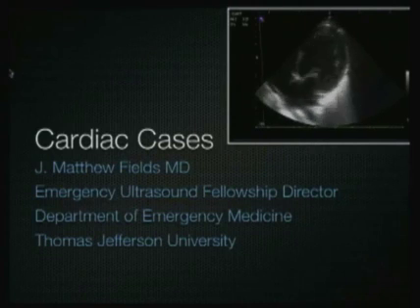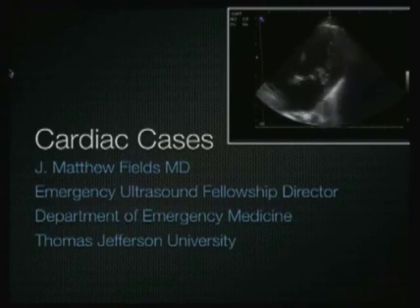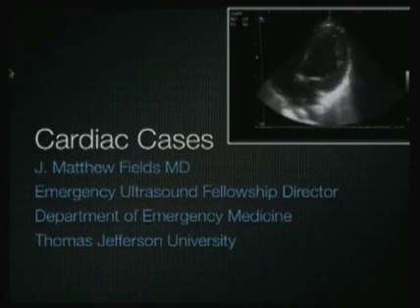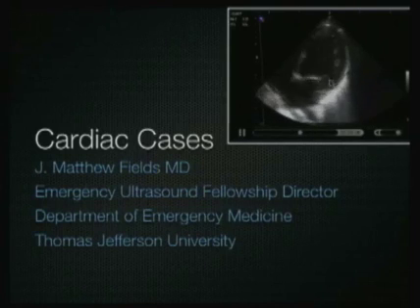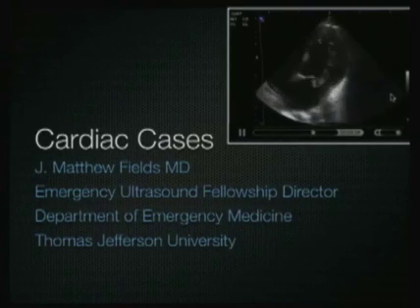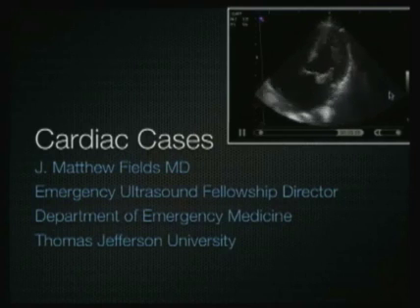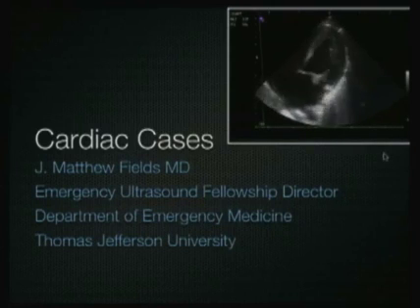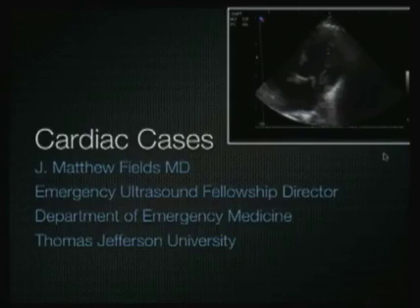For this example that I'm showing here on my title slide, just simply taking a quick look at this, hopefully you realize that this is something not quite right here, and you can see on the mitral valve a large hyperechoic mass, and this was a case of endocarditis. It's very, very easy to see.